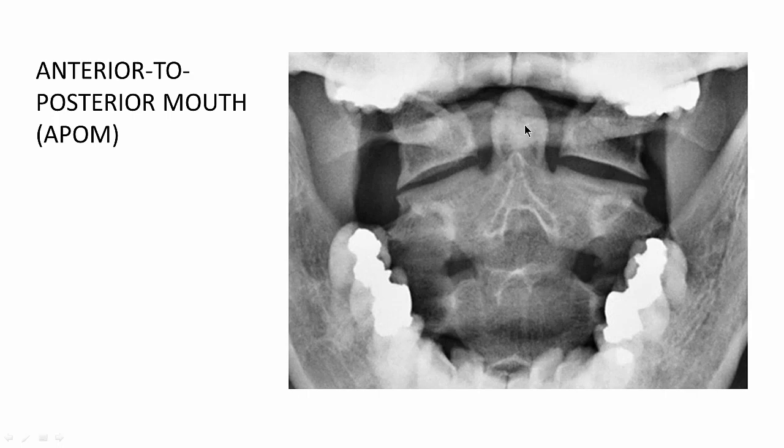And let's try to look at Atlas. It's hard to see here, but look real closely. Follow my mouse pointer. That's the transverse process. This is all lateral mass right here. Pedicles in there superimposed on that. Here's the other lateral mass. There's the other transverse process. See it sticking out, all this? Transverse process. Now look, this is hard, it's superimposed. But you can see it right here.